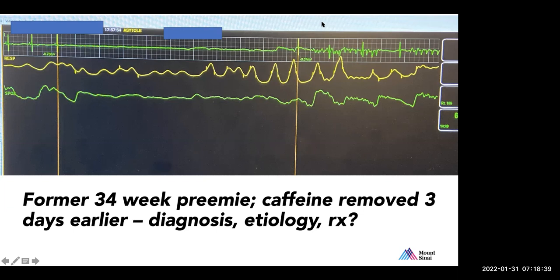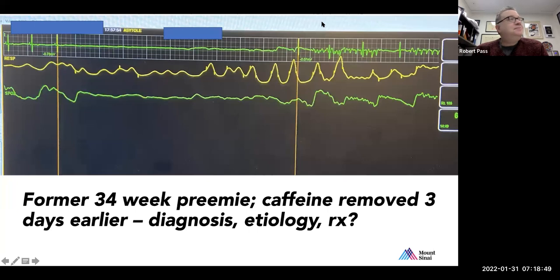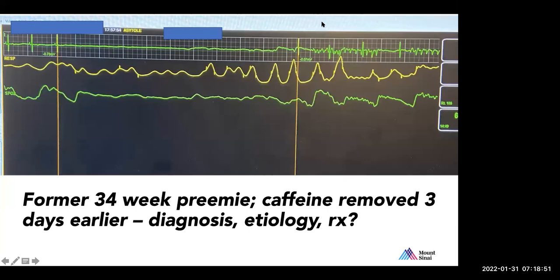So it's 9 big boxes, 9.5, I would say. How many seconds is that? 9.5 times 0.2, that would be, so it's about 2 seconds.